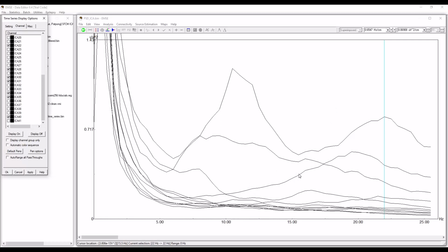I selected those, and you know, some of these are smaller down here, but they're still larger than the ones I left out. So why did I do this? Well, it's somewhat arbitrary, but you mentioned, Enrique, that you thought alpha and beta were interesting, and so that's definitely why I picked 11. But then I picked these others as well because they look like they have some interesting effects. So based on that, now that's for all of the intervals that we selected.